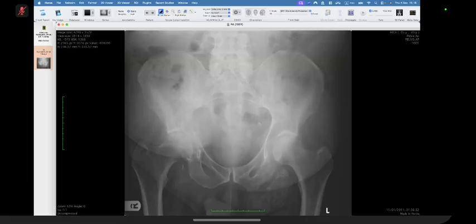So the primary pathology that I can see, I cannot appreciate the sacrum appropriately in this windowing. Yes, with windowing we can have a look. Otherwise, I cannot appreciate any other abnormality. If the patient has been having pain for a pretty long period of time, this may represent a neglected avulsion fracture of the ischial tuberosity on the left side, because there's also irregularity of the ischial tuberosity itself, so that would be my top differential.